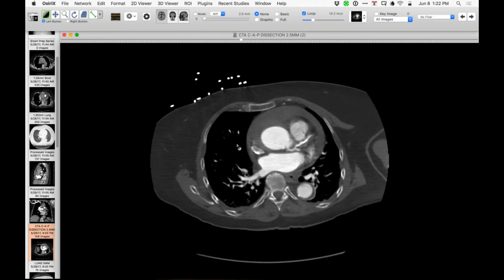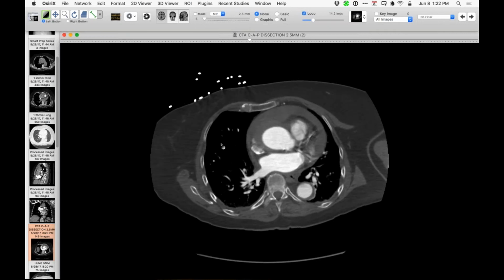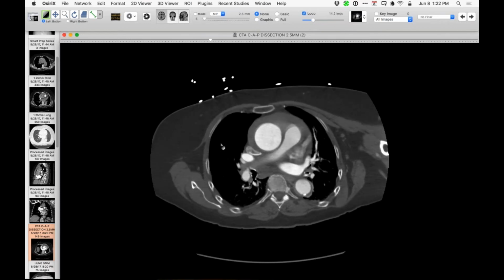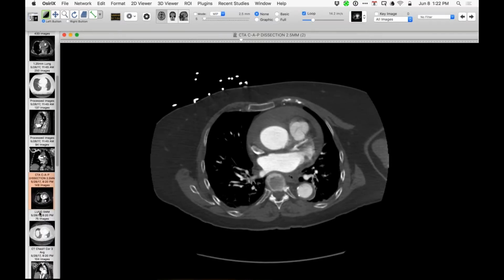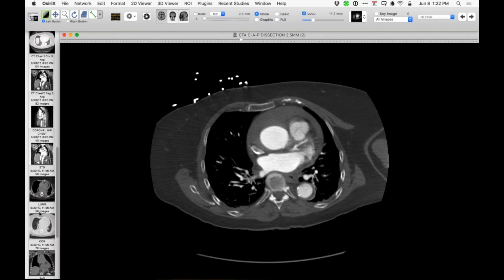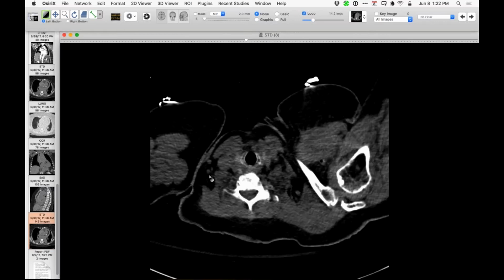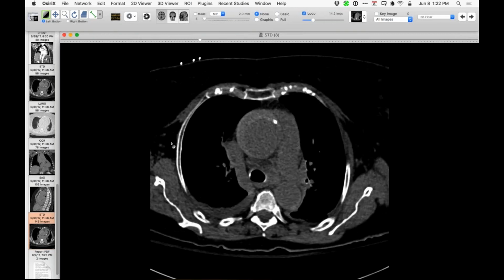And then she was admitted. They did some consultation, and surgery said, well, we'll follow her, but we don't know what it is, but they seem to just buy into the notion that it's some kind of inflammatory aortitis. So she was in hospital for a bit, and then they did a repeat CT. Now this is on the 30th, that being on the 28th. This is the one that I saw. And they just ordered a non-contrast CT, and I was presented with this to look at. So I'm looking at this non-contrast CT and trying to put everything together.